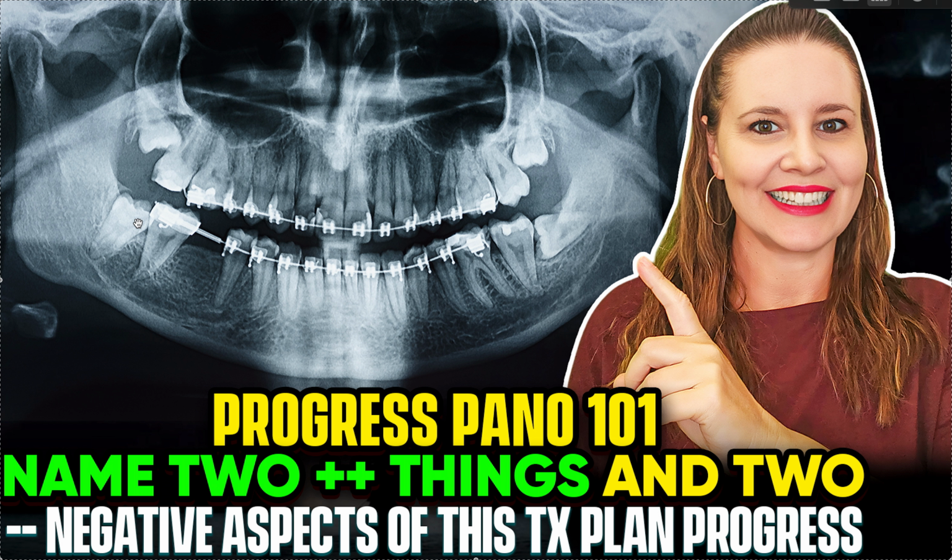So ideally this comes out and this gets seated properly, or you can put a bracket on there. But the bracket is probably not strong enough, given that there's a long span here, it'll probably break. So it probably wasn't a bad idea to put a band on it. They just have to take this tooth out so that they can band it properly, and then we're all good.